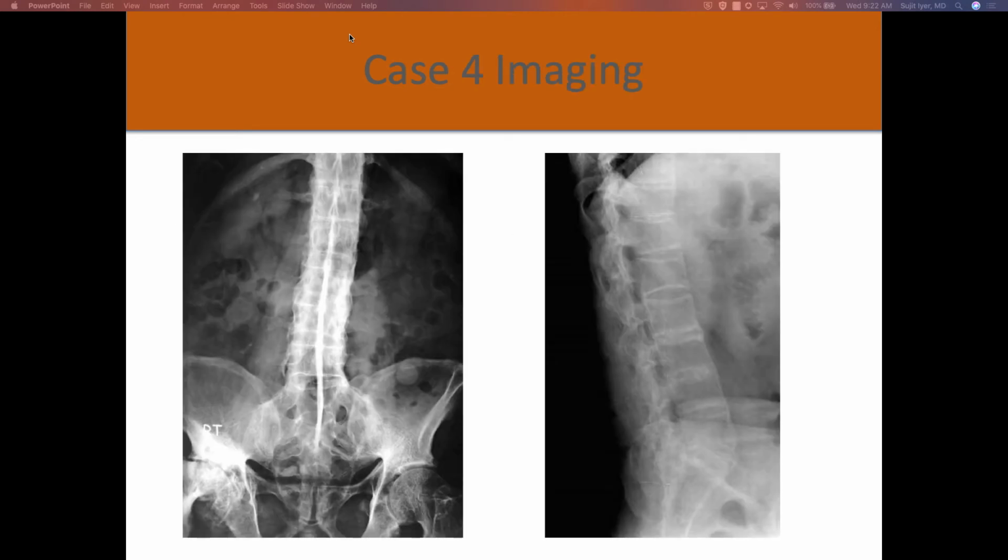And this is what you see on X-ray. Does anyone want to give a stab at it? Okay. Spine looks fused.